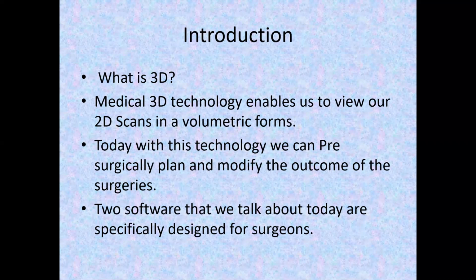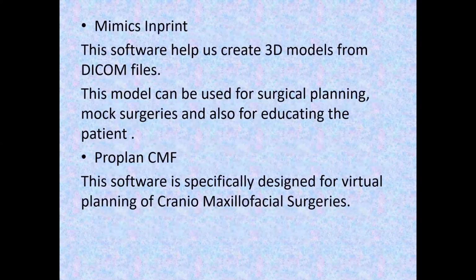The two software that we'll talk about today are specifically designed for surgeons, so they are very user friendly and do not involve engineering complexities. So the first software we'll talk about today is Mimics Imprint. This software helps us create 3D models from DICOM files. It gives us a file in STL format, which we can later print in a 3D printer.